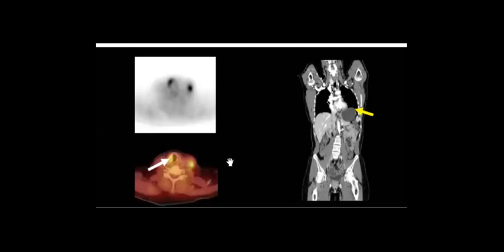Yes. So when you find the vocal cord with high uptake, if I told you that the primary here will be like laryngeal cancer, it will be the left or the right? Sorry, the question would be, if I told you that this patient has vocal cord paralysis, which nerve will be affected, the left or the right?